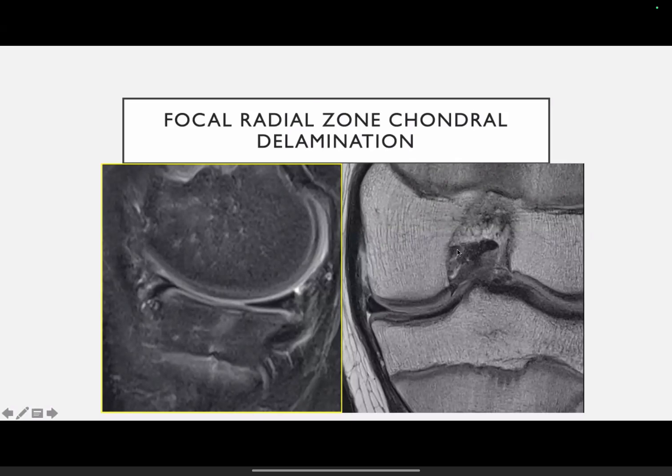So this is a pediatric age group as the growth plate has not yet fused, but as we can see here that there is subtle elevation or delamination of the cartilage from the subchondral plate. So this is a small subtle area of delamination. So usually the cartilage should present completely and homogeneously like in the case of the femur, but on the tibial aspect, what we see is that this cartilage is slightly elevated, and this is the site of the pattern of marrow edema, which is corresponding here.